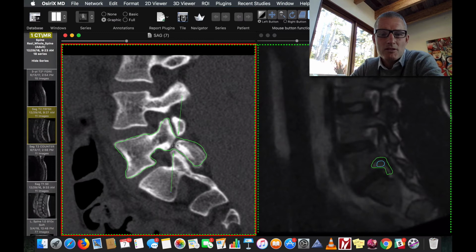And then over time, this stress fracture develops into a cleft, and in this case, this has been present for a significant period of time because we see good cortication of the ends of the bone, indicating that the outer surface of the bone has healed over and there's no longer any connection between these two. Now that's something that's very, very difficult to see here on the MRI scan, but it's quite easy to see on the CT scan.